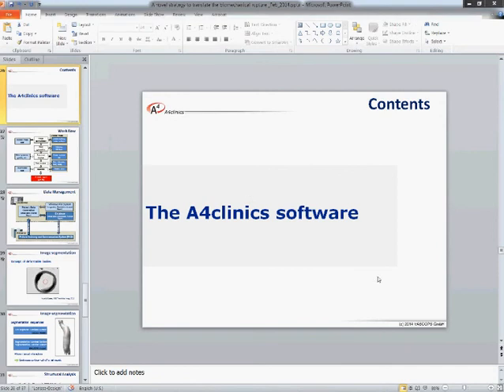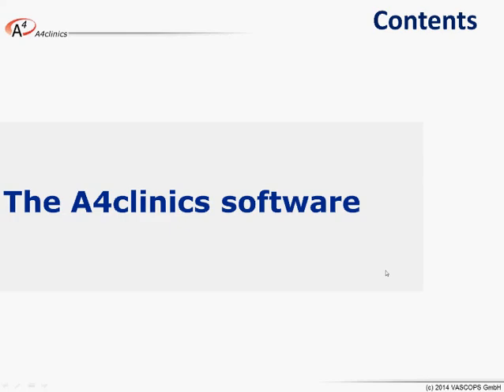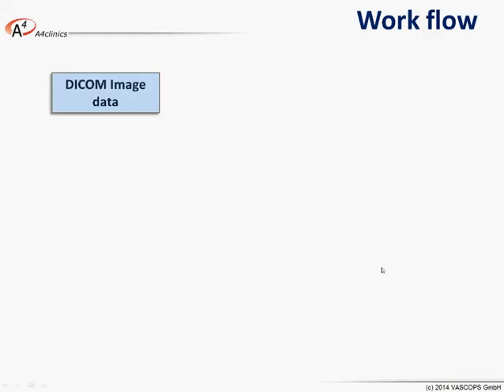So now let's come to the second part of the presentation, which is more focused on this software and more on its application. And everything starts with DICOM image data. So you load your DICOM image data, preferably computer tomography data. It's only CE certified for computer tomography data.